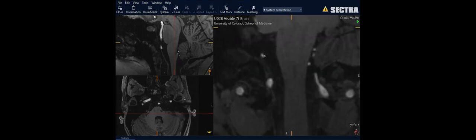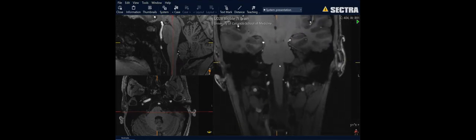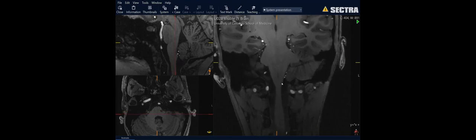Now, I would be very surprised if this was the level to which they're testing, because it took me a while looking at these images before I was somewhat confident to say that that's what we're looking at here. Certainly on a still, I don't know whether I'd be able to do it. Okay, let's take a look out and look more posteriorly.